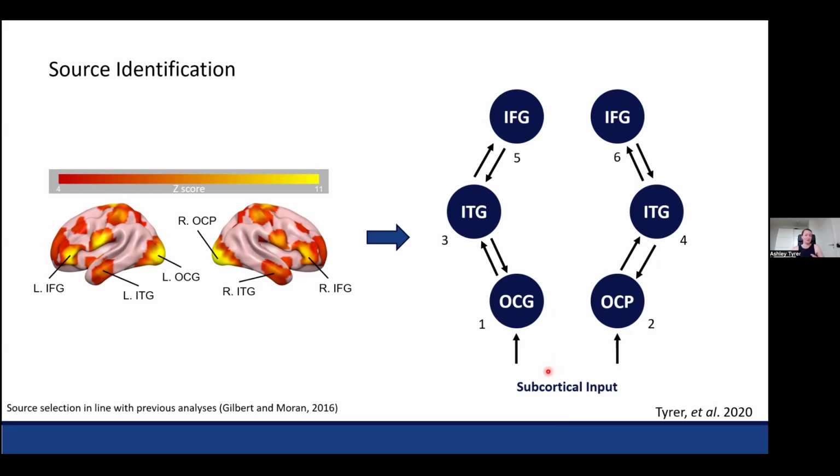Something I personally like to do, you don't have to do this, but I like to use the odd numbers for the left hemisphere and the even numbers for the right hemisphere. You don't have to do that, it just helps my brain mentally map where everything is, basically.